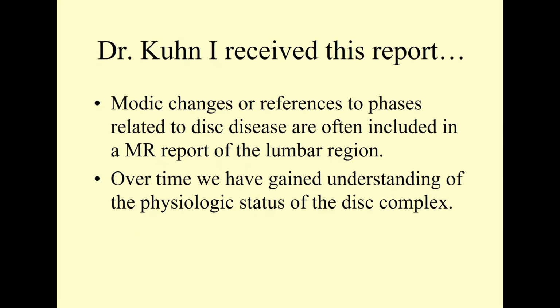Now, I want to talk a little bit about MRI and discopathy, particularly in a degenerative setting. I've had the great pleasure to spend time with Dr. Michael Modic, who first put this work together for us. The so-called Modic changes, or sometimes referred to as physiologic changes, take us through the various phases from normal disc to abnormal disc. And when MRI was first becoming routinely available, some of the imaging of what turned out to be simple DJD was really frankly startling, and a lot of false positive reports were written, and I would say that even led to unnecessary surgery. But thanks to Michael Modic's work, we now have a very clear understanding of what's going on and aren't going to fall for it. We greatly reduced the rate of false positives through his work.